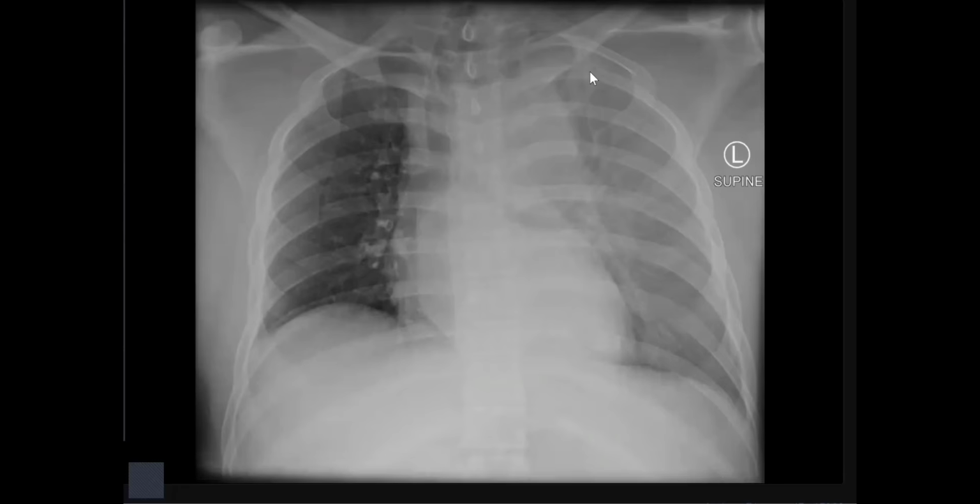Very good, my friend. Veiling of the left lung field could be related to hemothorax as the patient is supine. The fluid spreads posterior to the lung.